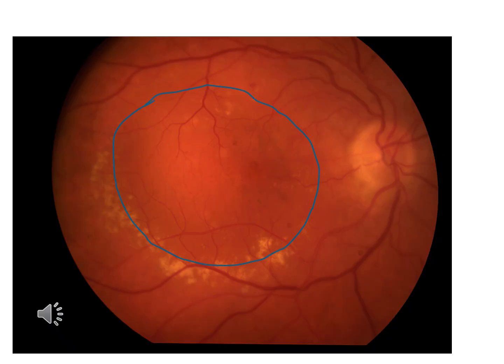This is a 64-year-old gentleman who's had blurred vision in the right eye for about 6 months. His vision is recorded as peripheral only. The area encompassed by the blue line is elevated pigment epithelium. If you shine the slit lamp, you will notice that the blood vessels do not cast an abnormal shadow because they are still in the normal position overlying the pigment epithelium.